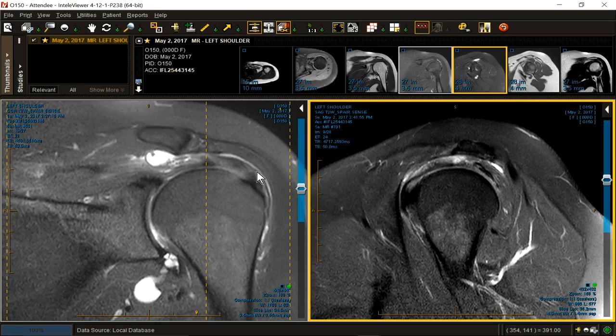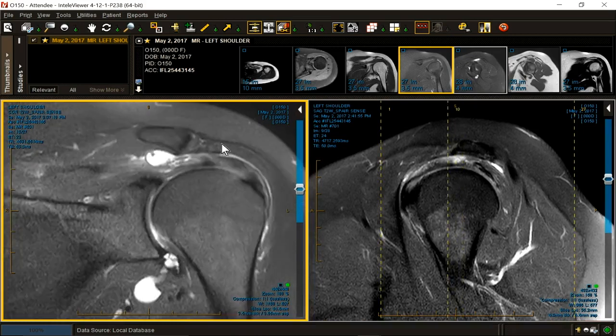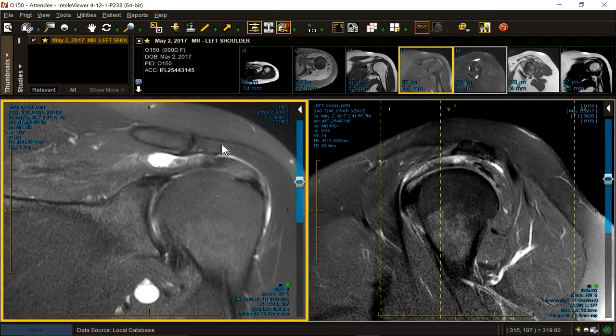Associated small pinhole, 3/4 thickness, posterior supraspinatus microtear, period. Rotator interval tear with sentinel cyst formation, producing a mass, and degeneration and atrophy with 3+ fatty infiltration of the supraspinatus, mass X by X by X centimeters.